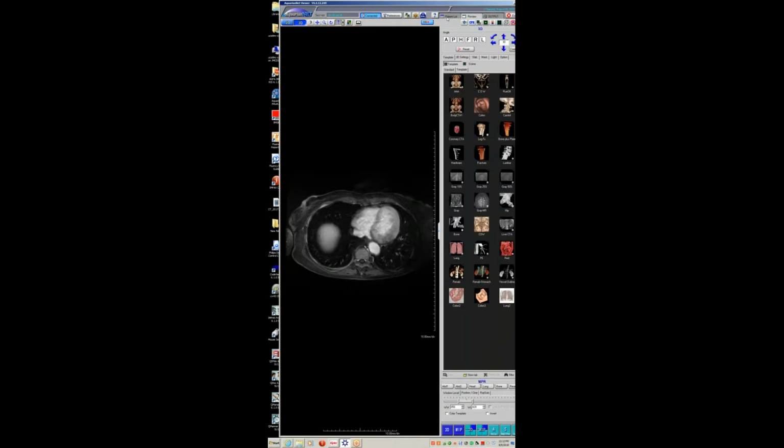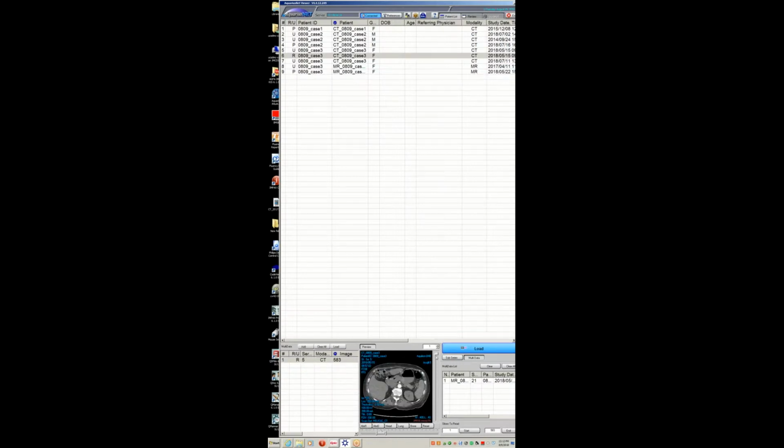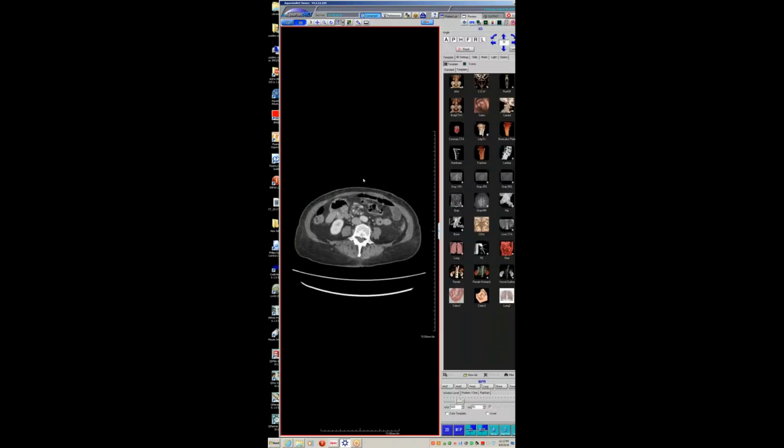Now, the interesting thing, and I've talked to Travis and maybe some of you other guys before about this, we here get two different studies. We get a chest during arterial phase and the abdomen and pelvis during portal venous phase. Unfortunately, they come across as different studies, and honestly, I don't review their images. And I didn't read this, but I could have made this mistake as well.